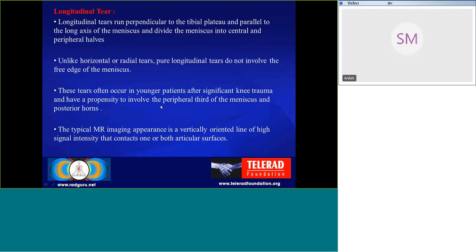Come to longitudinal tear. The longitudinal tear runs perpendicular to the tibial plateau and parallel to the long axis of the meniscus and divides the meniscus into central and peripheral halves. Unlike the horizontal or radial tears, pure longitudinal tears do not involve the free edge of the meniscus. These tears often occur in younger patients after significant trauma and are likely to involve the peripheral third of the meniscus of the posterior horns.